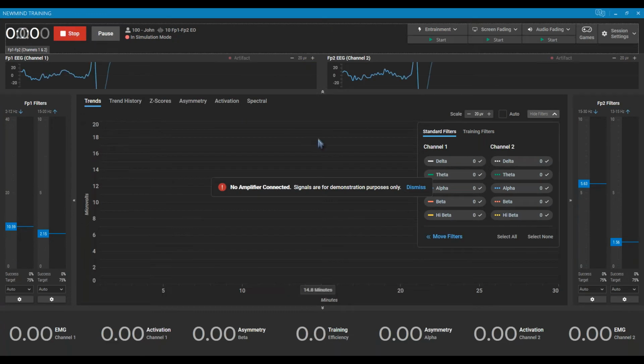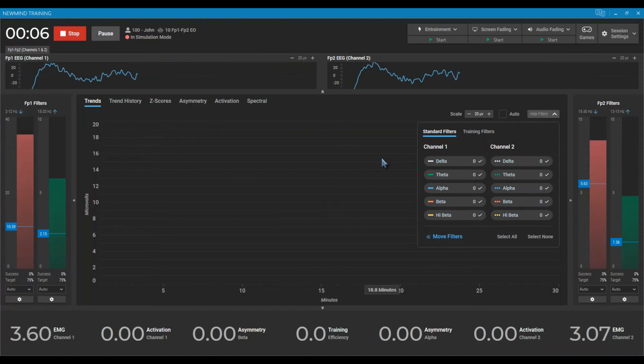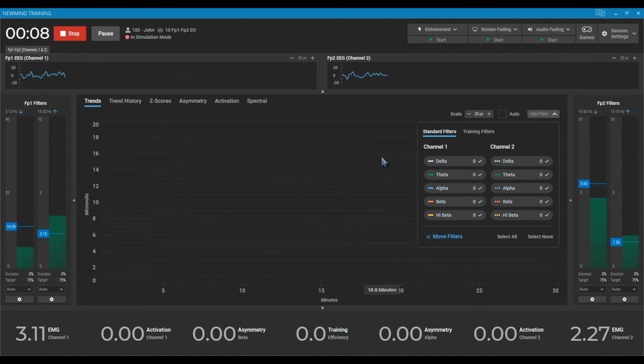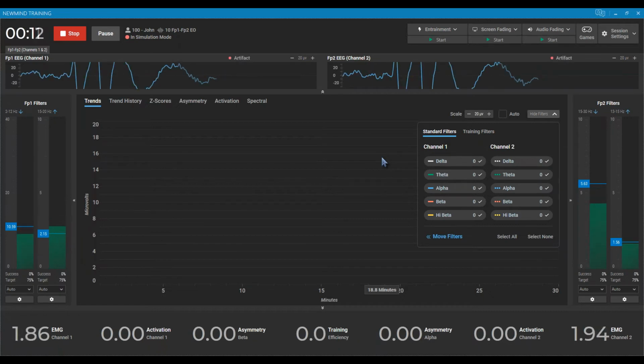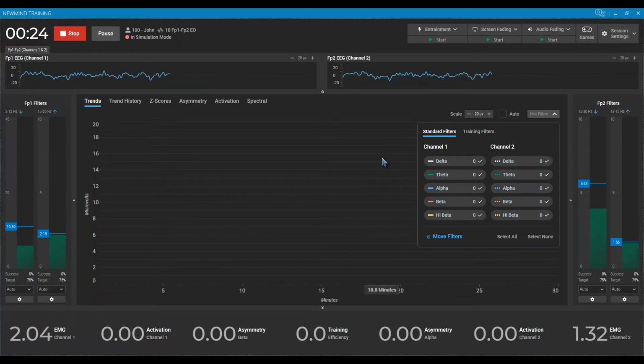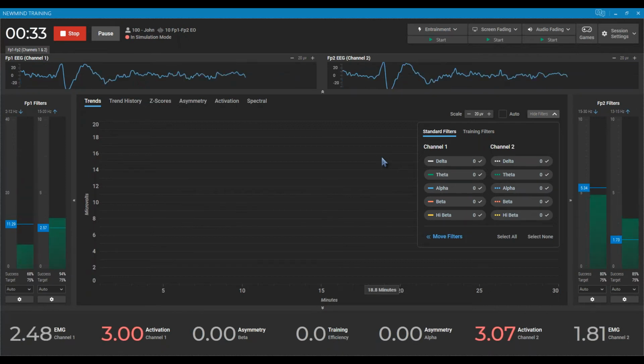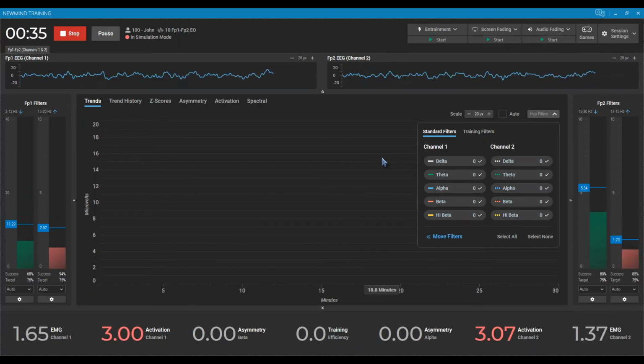How does the feedback from what we're seeing now, the layering, the convergence, and the compression, help us be more effective in training? How do we adjust the protocols? For example, with convergence, I often see that the whole EEG on the left is way higher than the right. If the convergence is off, can I change the thresholds on the left and push it down more? Is that the strategy, or do you just try to bring the right up and the left down? That's another question for Dr. Suter I would like to add.